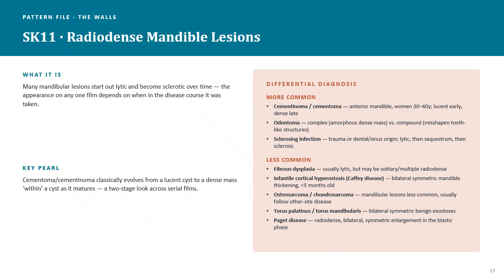Infection and other bone diseases can cause some of these changes as well. So with these types of lesions, we might see a white or dense area in the mandible. We're also going to be looking at the location, the appearance, and how the appearance changes over time. That will typically help the radiologist or the doctor determine what the overall cause is.